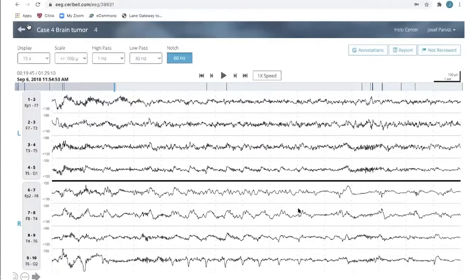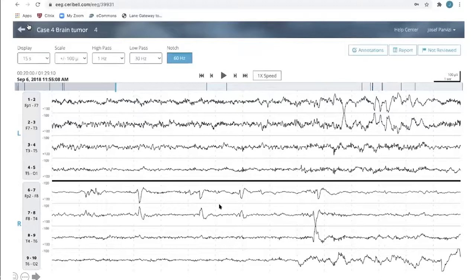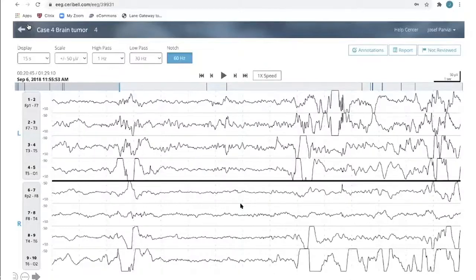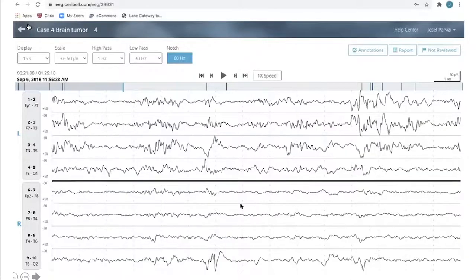Here I'm seeing some slowing, but also some recurrence of some of the spikes. I'm sorry, I went back one page. Okay. So here is basically going from what you're saying, a repetitive, continuous pattern to something that is not as repetitive. And do you think this is related to the patient's right temporal tumor? Don't know. I think, of course, plausibly and reliably, yes. And here there's some movement artifact.